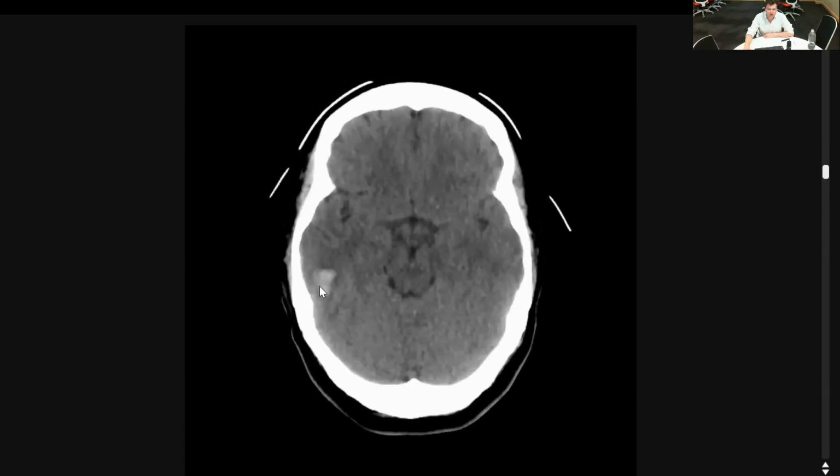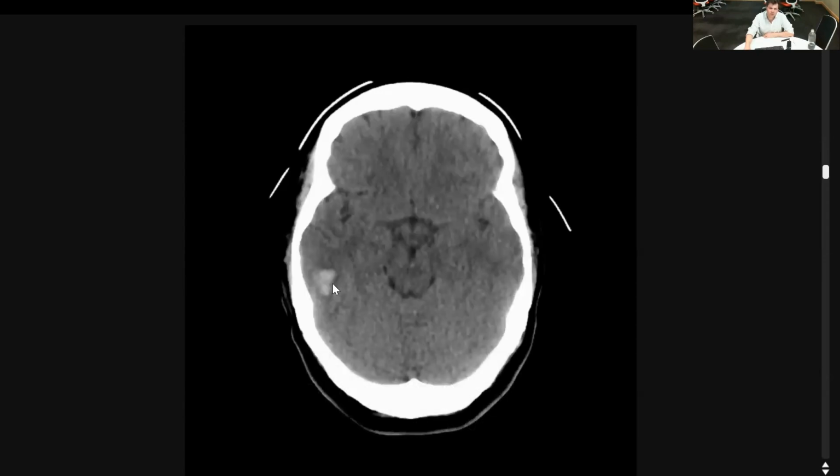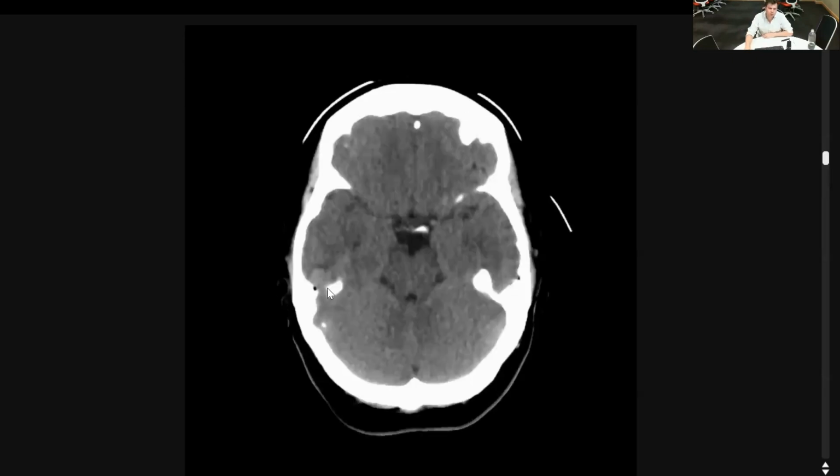Now, this is a tip which Jeremy mentioned just a couple of weeks ago: you can see there's a wee bit of edema around this. And that's a clue that this is a parenchymal bleed. So it's not something which has come from outside in, pushing on the brain. But if you've got a bleed inside the brain, you can get a bit of reactive edema around it.